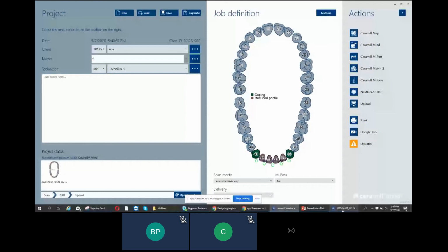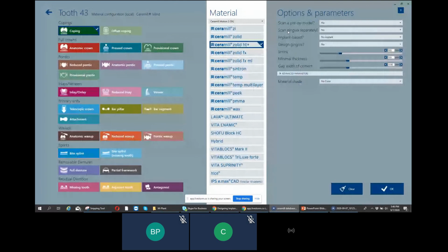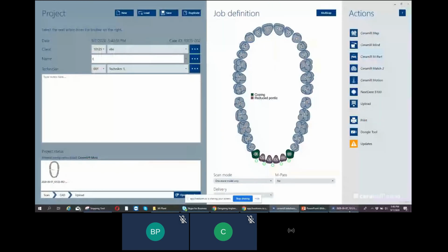So guys, here in this case, I will show you how to use your implant software if you don't have Ti-base or Ti-connect, anything you name it, and you need to use the implant shape to create holes over any titanium, any abutment, any screw-retained abutment. So you choose here normal crowns without implant.